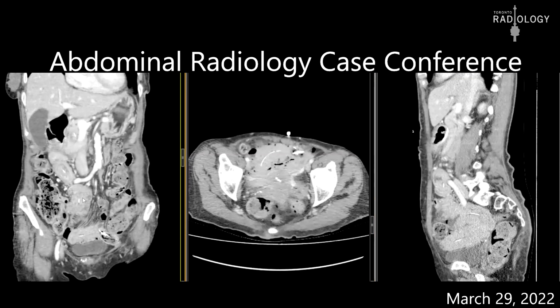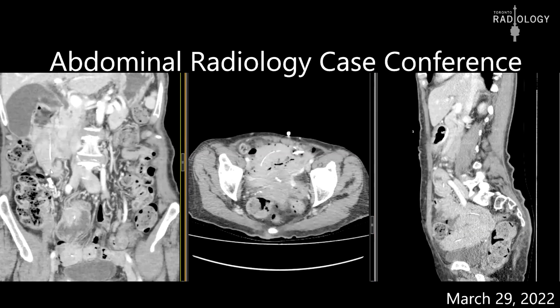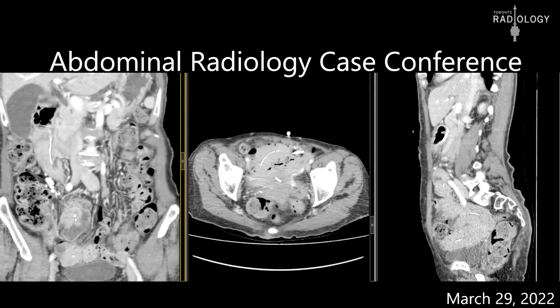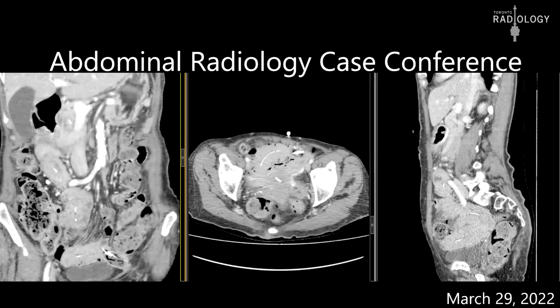And when we look at the coronal, you're absolutely right. It does look like that could be some weird kind of intussusception. There could be something weird going on here. And I didn't really figure out what was going on at this point.